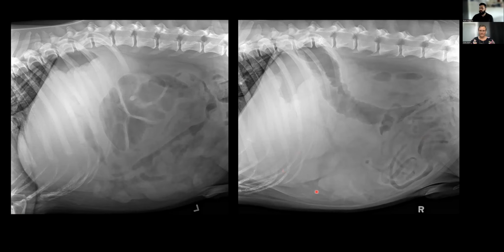All of these little wispy soft tissues, which sit here, especially superimposing the falciform fat, that is evidence of peritoneal effusion in this dog. So we've got peritoneal effusion in our dog. And when we look at the stomach, especially, the stomach is quite abnormal to me.